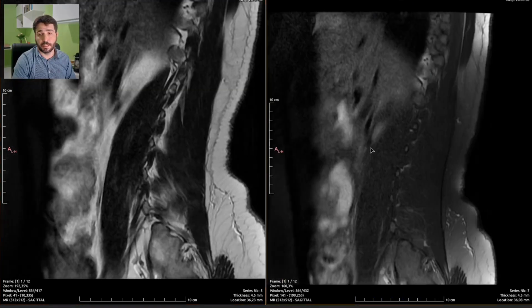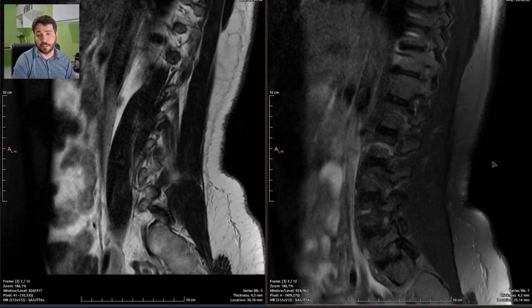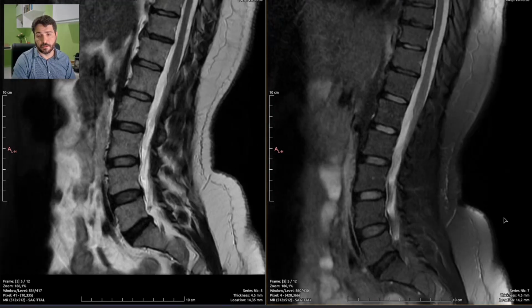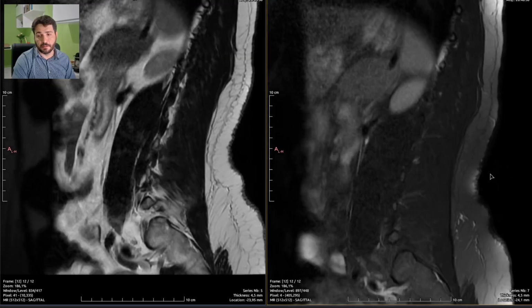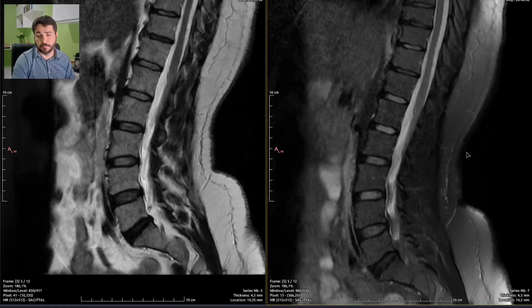And I know you guys are screaming on your chairs because I didn't mention this mild edema of the subcutaneous tissue and the gluteal region, the buttocks, on this patient. This is related to the clothes and the prolonged bed rest.